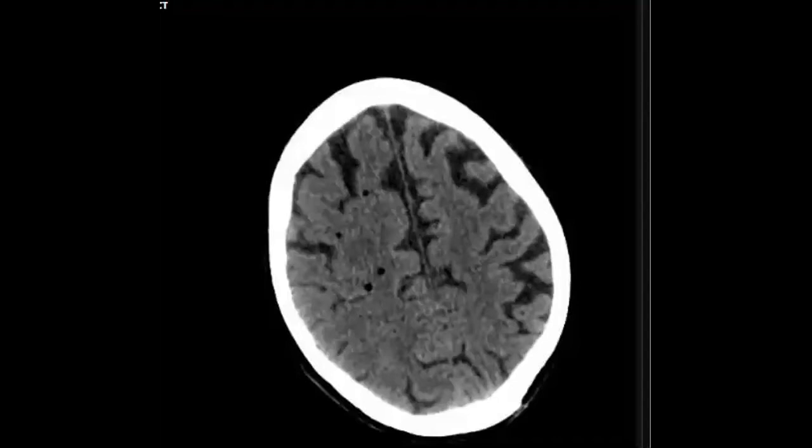Dr. Muhammad, yes. Yes, so this is what is called air embolism. Yeah, it's not very common to be honest, but just think about it. One of the important things is that it can be air embolism, iatrogenic, yes, iatrogenic. Let's see this case.